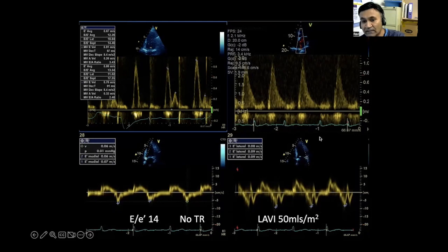So diastole, yes. There's diastole is much more than the systole. All points towards elevated left atrial pressure. There's hardly any S wave at all, is there, to do your S to D ratio? So if you can all see that, this is our pulse wave Doppler through the pulmonary vein. Normally we'd have a nice S wave, which I'll show you some pictures of, followed by the D wave, which is generally smaller than the S wave.